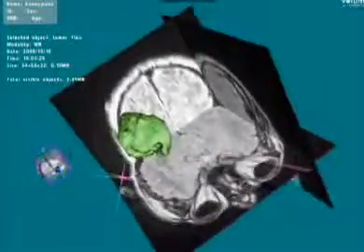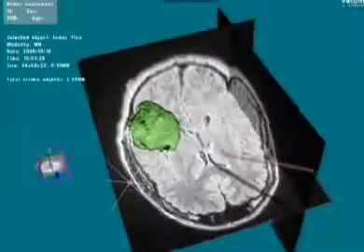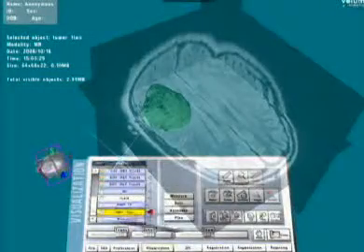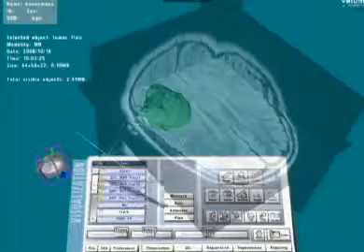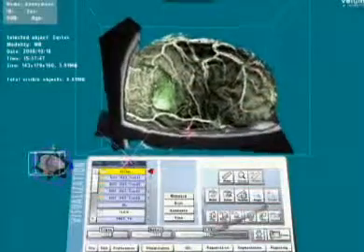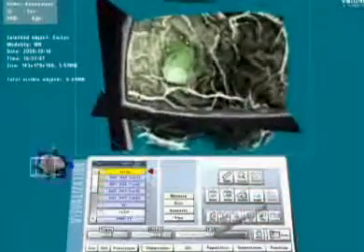You see some of the basic stuff as we go through in terms of location. This was just one acquisition, a volumetric acquisition in the 3T magnet. I just wanted to show what you can do with that acquisition using modern software and graphics, as well as show what DTI imaging can show.